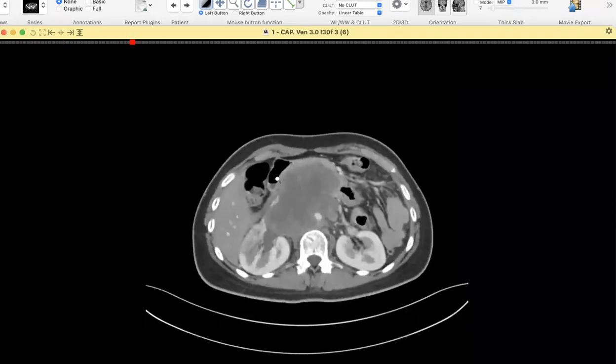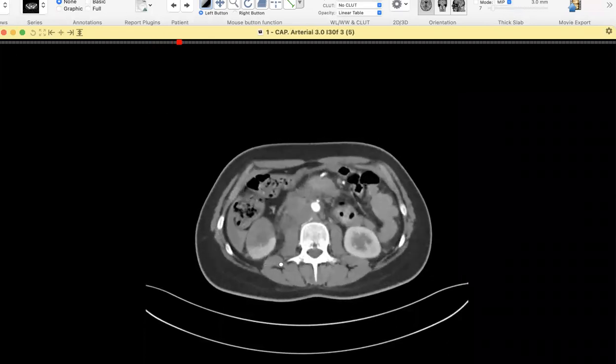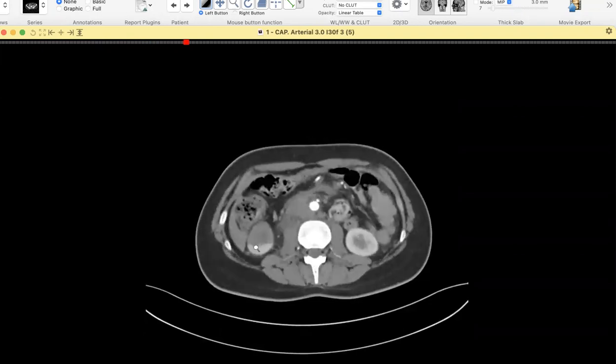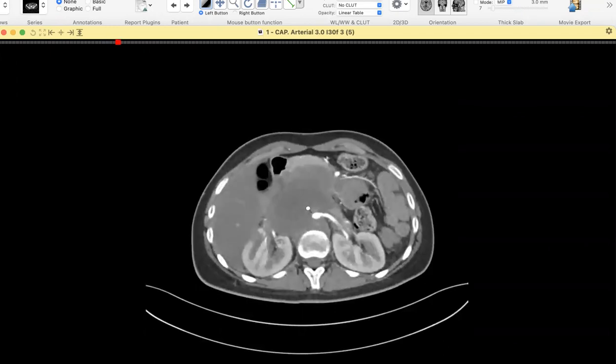This was a lymph nodal mass, conglomerated lymph nodal mass, perfectly described. There's encasement of the right renal artery, and you said right renal infarction. This is just ischemia. It's not completely infarcted. So you have to first describe the finding, which is lymphadenopathy, and then you have to give the etiology for that finding, or the differential.